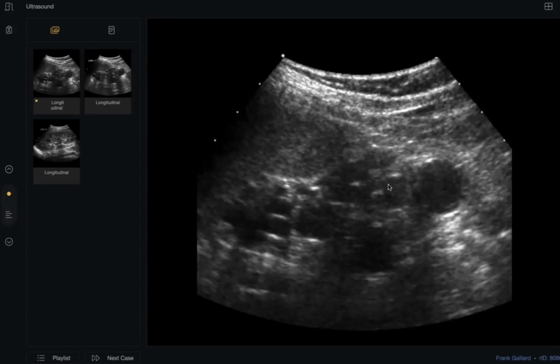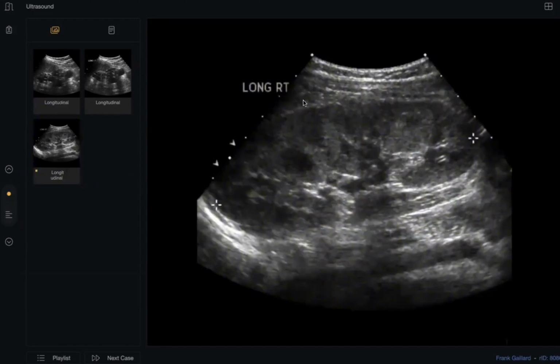This is the most important. Why? Because this kidney, we lost this kidney, non-functioning almost. The most important is the healthy one, it is compensatory hypertrophied, and fortunately, no hydronephrosis. But you must tell the examiner, PUJ obstruction is a very common association. Okay. Thank you, doctor, so much.